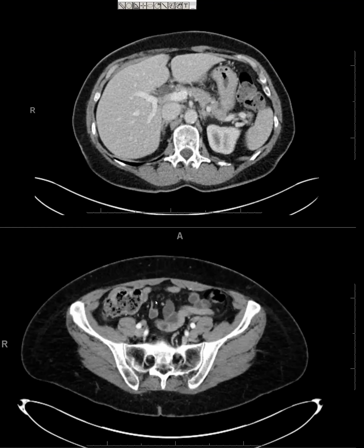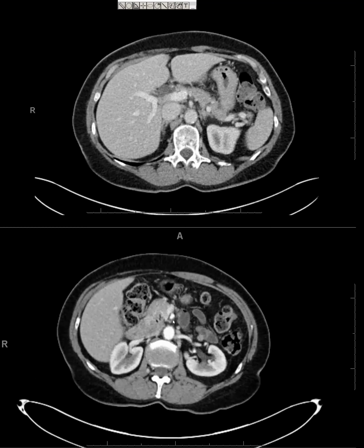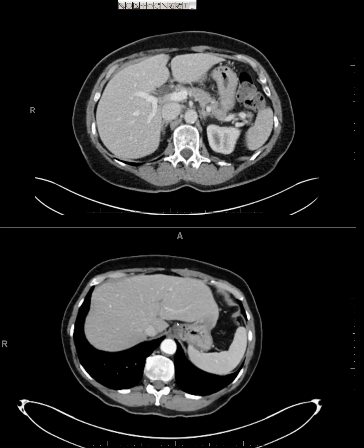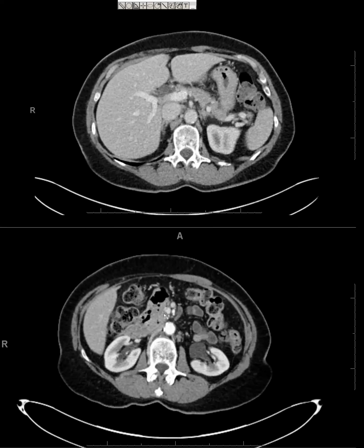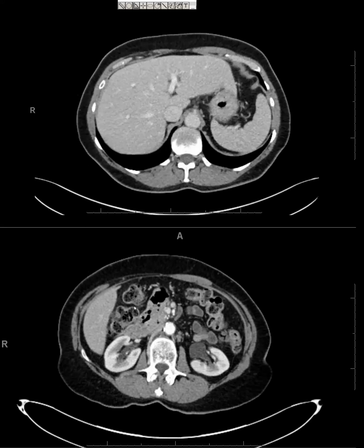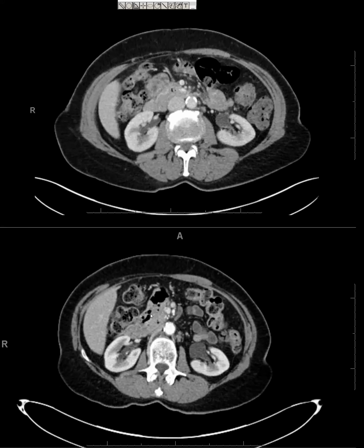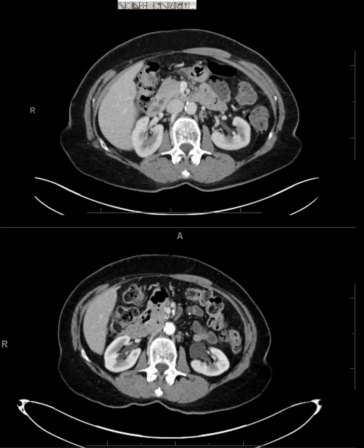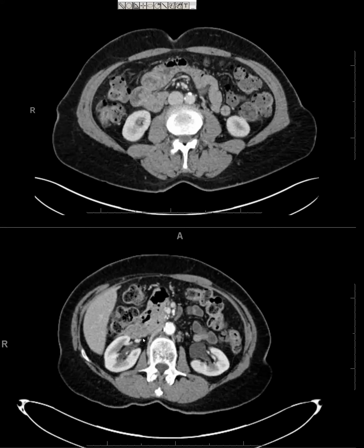So this was described as malrotated bowel in an adult. I don't think they speculated at the time whether or not it was related to the patient's symptoms, but interestingly, the more recent one with no surgical intervention of any sort has a transverse duodenal segment here and a first jejunal branch that goes around the backside of the mesenteric root like it normally would. I mean, it kind of continues on there beyond that.